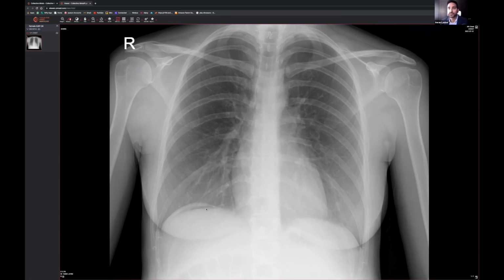But in this situation, what we can see is a diaphragm over there, and below the hemidiaphragm there is this radiolucent line sitting over here. That is subdiaphragmatic air, which would be consistent with pneumoperitoneum or subphrenic gas. That can happen because of a perforated intra-abdominal viscus. So there's a perforation that's happened somewhere, or some air that's been introduced into the body somehow from somewhere else. Now, I do have a case which I will be going through later, where you've actually got something called a continuous diaphragm sign, where you've got air sitting.